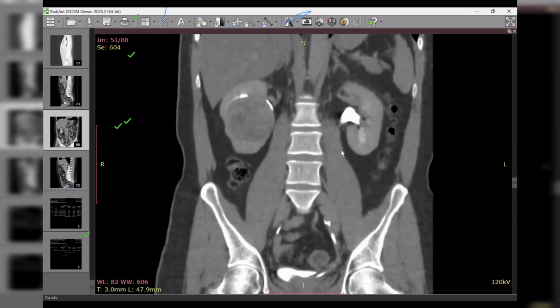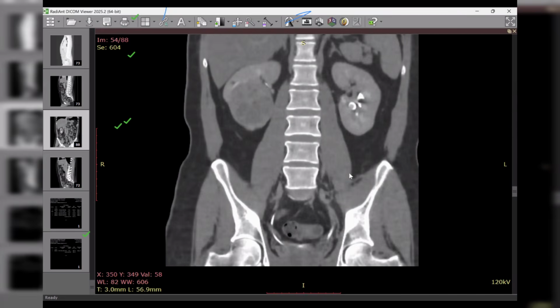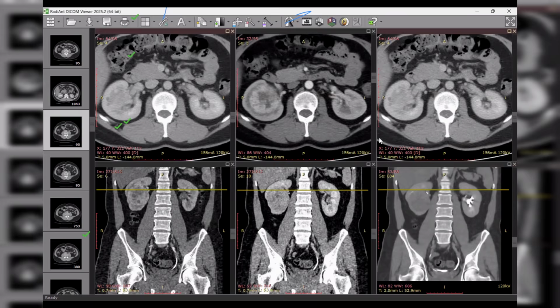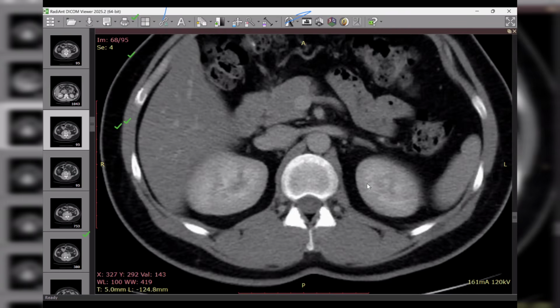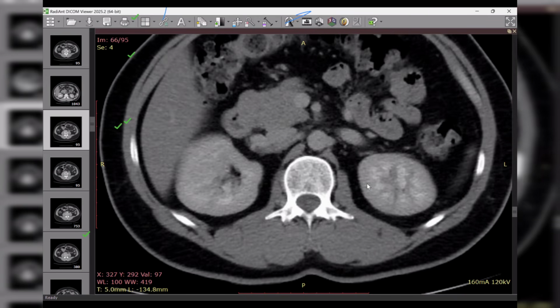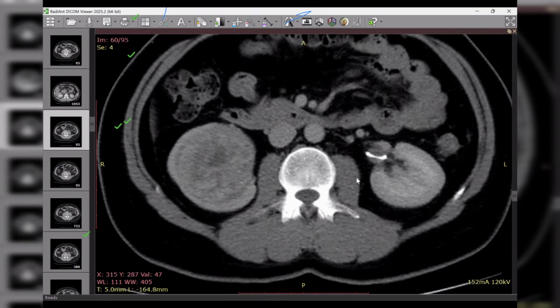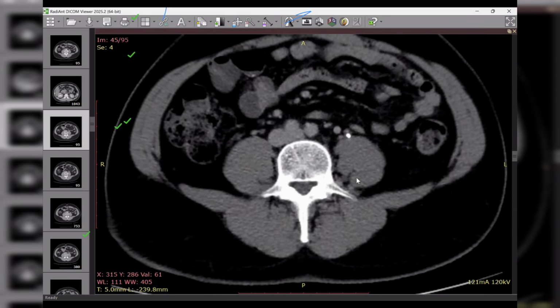If there are any other similar lesions which are not seen, and if there are any lymph nodes, surrounding lymph nodes. There is no obstructive uropathy I can see right now. The vessels are already patent, and no invasion into surrounding structures. You did it very well actually.